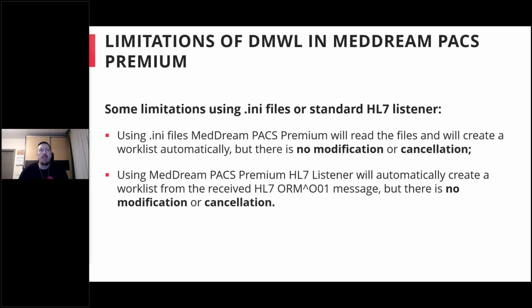So for example, with the ini files, it will create the worklist automatically. It will import and store it in the database, but there is no modification or cancellation of this worklist, meaning that you cannot create an ini file telling it to please modify the John Smith worklist or please cancel the John Smith worklist, because it is not supported.